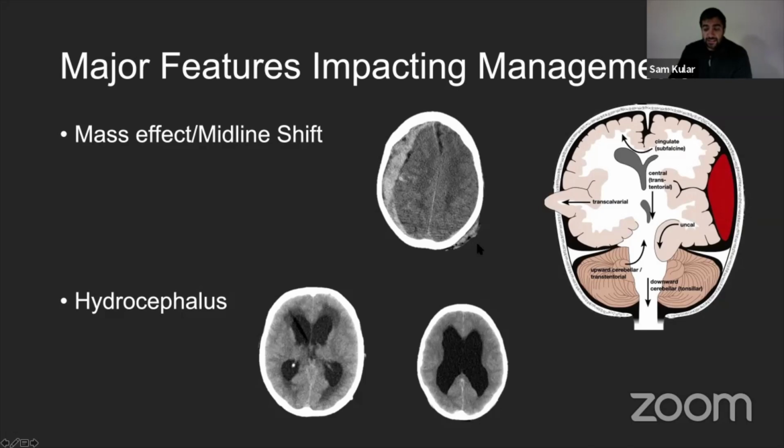These are the key things to look out for, because if we squash the brain parenchyma, it can lead to compression of the brain stem, and the brain stem is important for our respiratory center. If we can't have a respiratory center, we can't breathe, and therefore we will essentially have a fatality from that. So it's important to look for any features of mass effect and what we call coning, which is where the cerebellum, cerebellar tonsils and brainstem start to descend into the spinal canal.